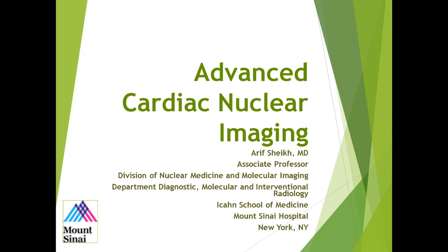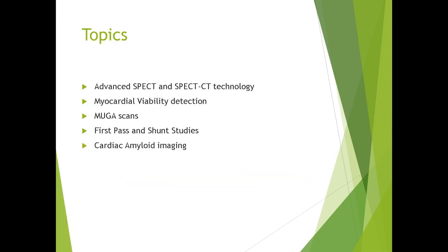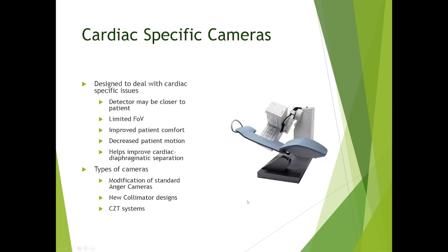This will be a talk about miscellaneous topics that are important to know that are clinically being done in cardiac nuclear imaging. So we will cover some aspects of SPECT-CT technology, also myocardial viability detection, also talk about MUGA scans, first pass and shunt studies, and the latest development, which is cardiac amyloid imaging, all of which are now being used routinely as part of nuclear cardiology.